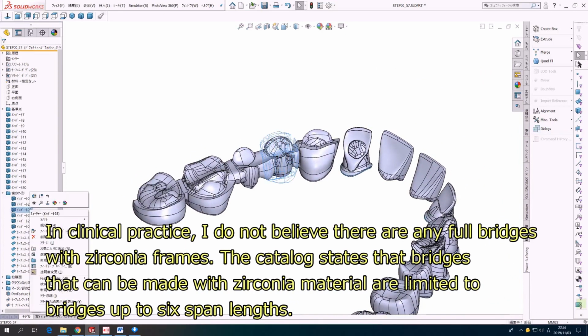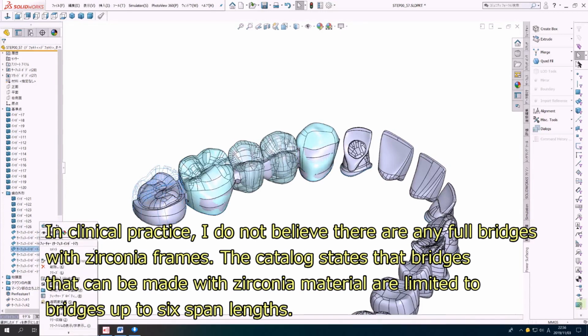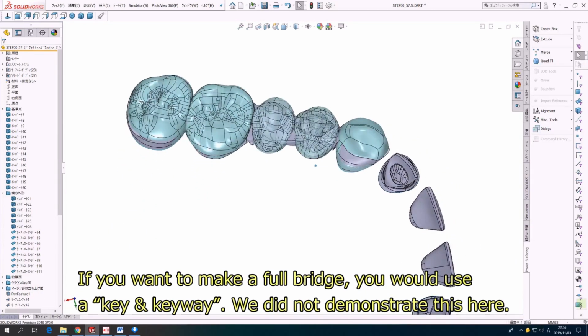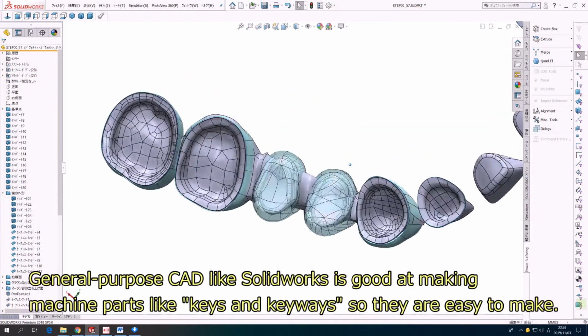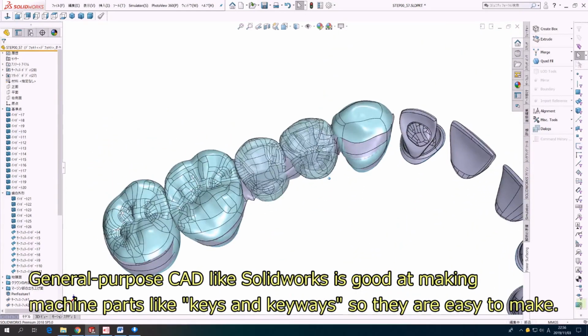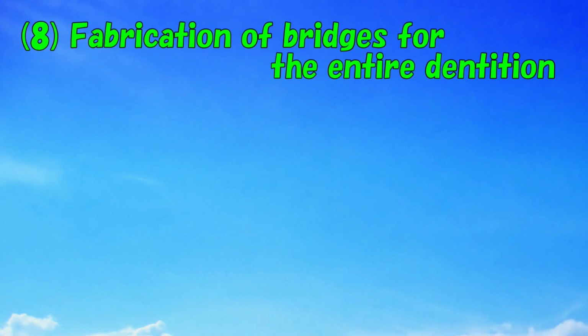In clinical practice, I do not believe there are any full bridges with zirconia frames. The catalog states that bridges that can be made with zirconia material are limited to bridges up to 6 span lengths. If you want to make a full bridge, you would use a key and keyway. We did not demonstrate this here. General purpose CAD like SolidWorks is good at making machine parts like keys and keyways, so they are easy to make. 8. Fabrication of bridges for the entire dentition.